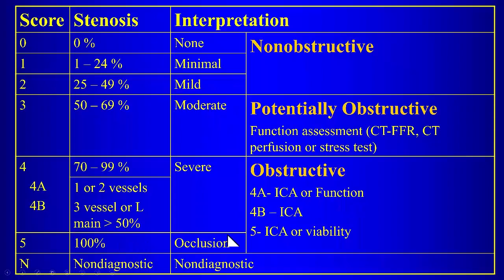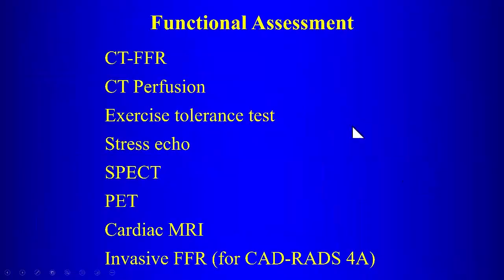And if you have a completely occluded lesion, a complete occlusion or what looks like a complete occlusion on CT, you might suggest invasive coronary angiography or a viability study, in other words, an MR or something, or a PET, to see if there is viable myocardium there, because if there has been an infarction and you don't have enough viable myocardium, then it's not worth revascularizing, okay? So this is something you need to be familiar with.